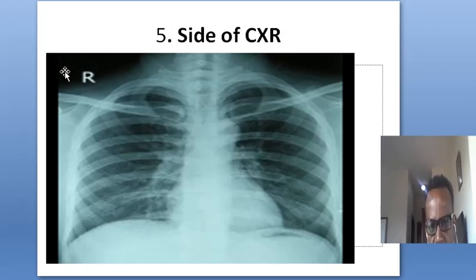But this is not enough for all physicians. This labeling may be mistaken, or sometimes the labeling may not be there. So because of this reason, one should look for anatomies which are very important to identify which one is the right and which one is the left side.